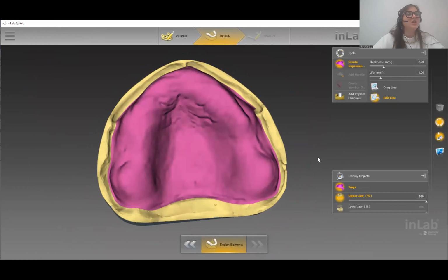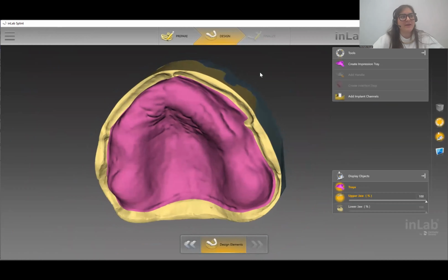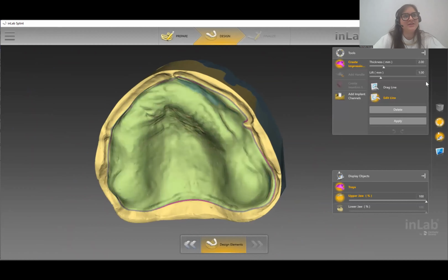For example, sometimes people will call me and say, Michelle, something's wrong with my tray. It won't move forward, but it's paper thin. I can't proceed. The software won't let me. That's because we haven't applied the parameters to this actual tray. So we need to give it a click so it's highlighted in green, and ensure that the thickness and the lift are set.